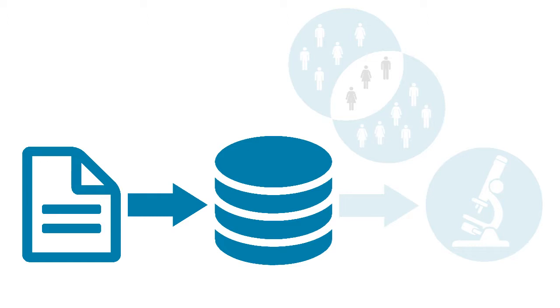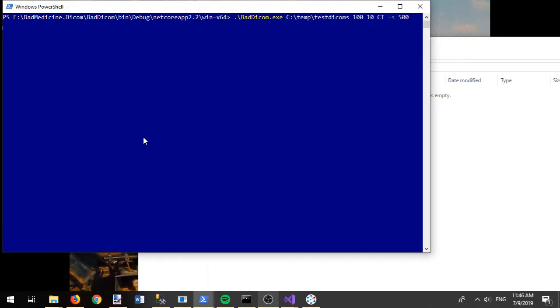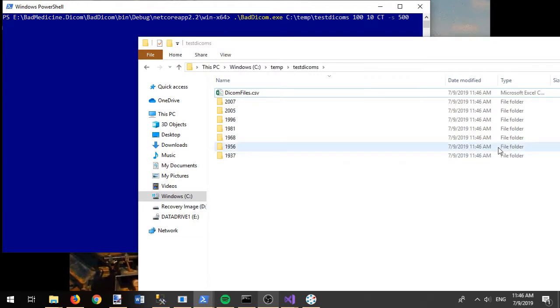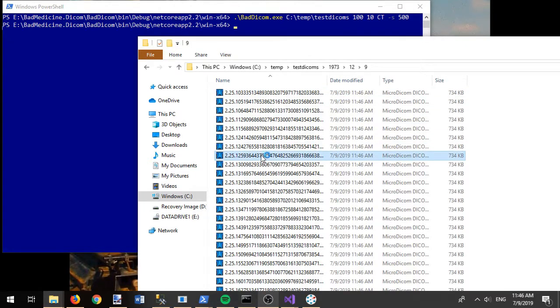We will start by looking at how we load DICOM images into the relational database. This involves extracting the file location and relevant tags such as modality, patient ID, and study description from the images. We will be using the tool BAD-DICOM to generate some test studies using the same seed as the regular test data already held in this RDMP instance.